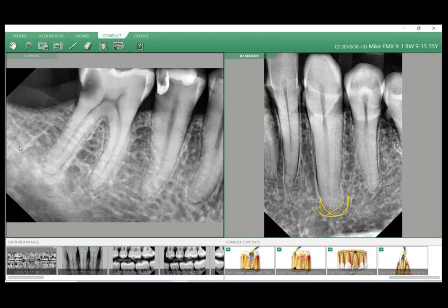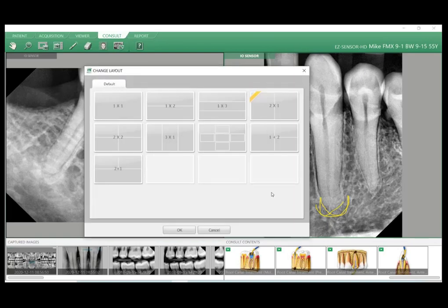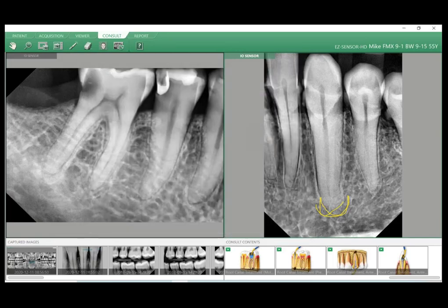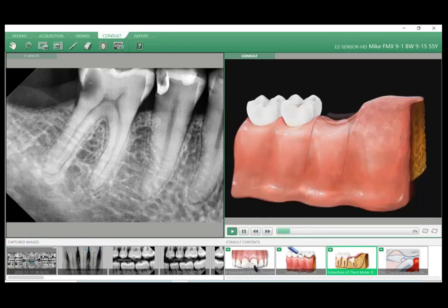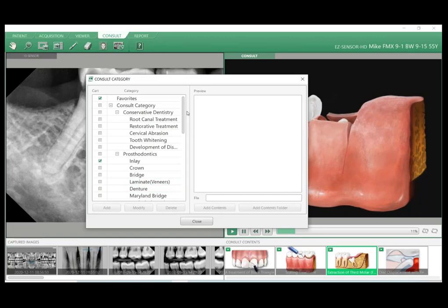This is a very powerful tool for our offices to use. If you click on the defaults, it's just going to show the favorites on the lower right, like you said, so you don't have to search for all those. And similar to your layouts, you can also go in and hide the different videos through that editor. Our offices will customize that. I don't need anything TMJ, or I want to uncheck these, and then it hides all those.